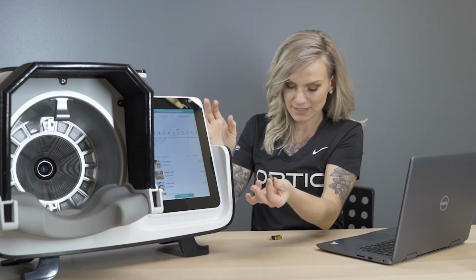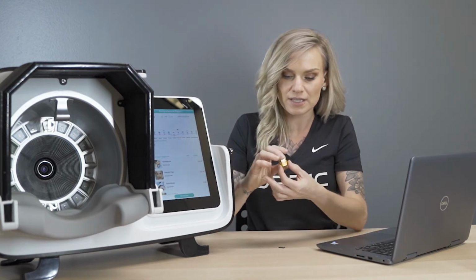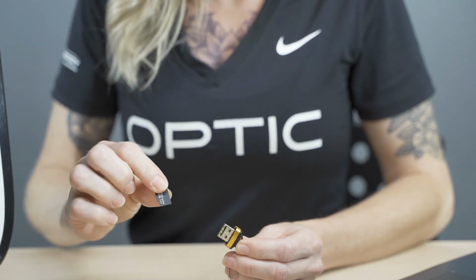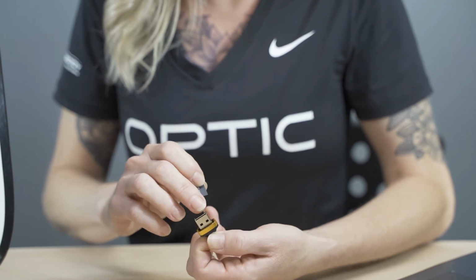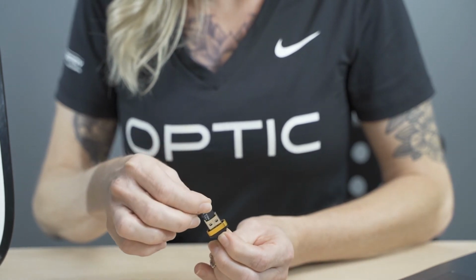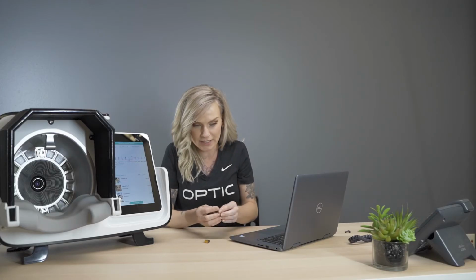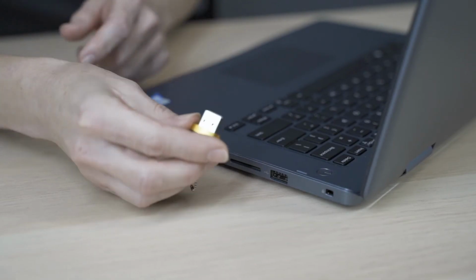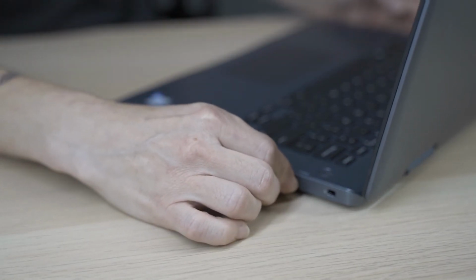So from here, we take this SD card with our USB. Now, this USB slides right out. It also acts as an adapter. We're gonna take that SD card and put it into the side that has the little metal missing. If you flip it on this side, it's flat. This is the adapter. White letters faced out, and it's gonna slide right into the adapter port. And now we're able to stick it into any desktop or laptop computer. Plugging this into the USB port, make sure that SD card is face down, and then we'll slide it right in.